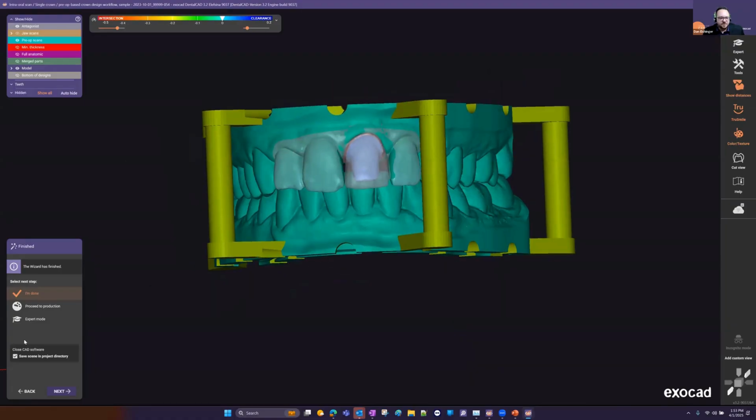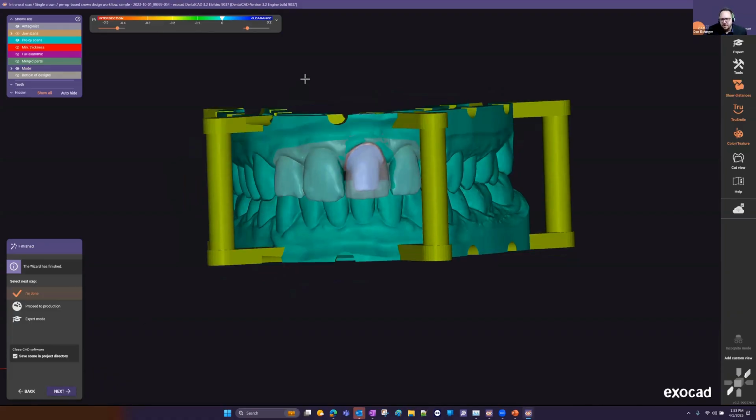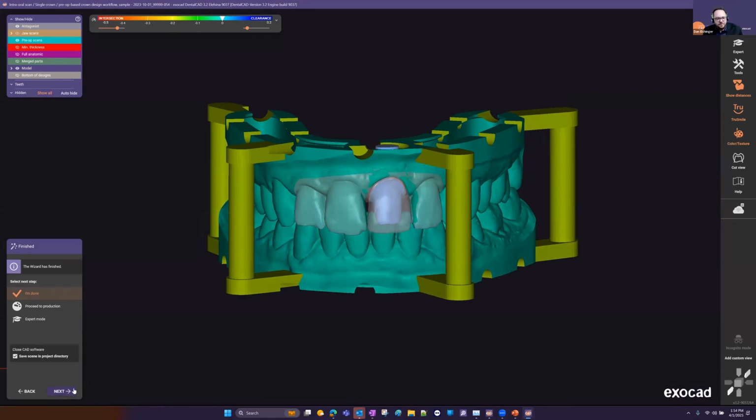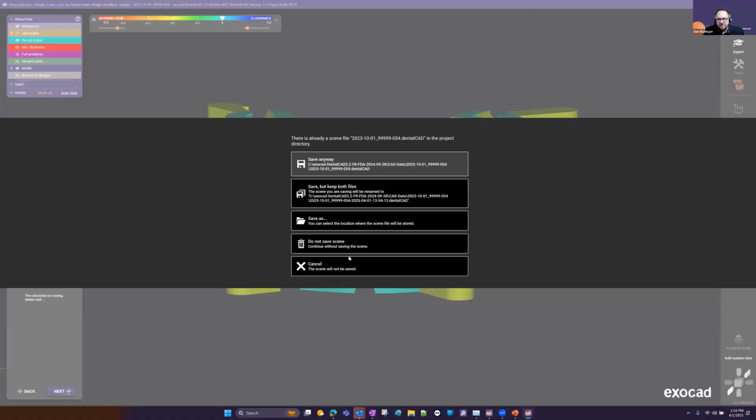So let the software work in the background for you. Utilize those automated features, and there's a lot of them, and it's going to help your production, help you get through that work quicker. And from an organization standpoint, if you're doing high volume, you can really focus on getting those design works finished at an extremely faster rate. And then outside of that, there's your model creation and so forth.